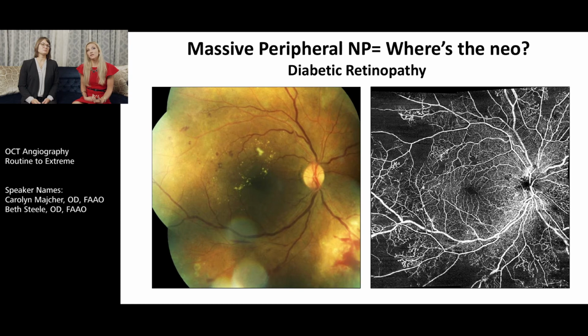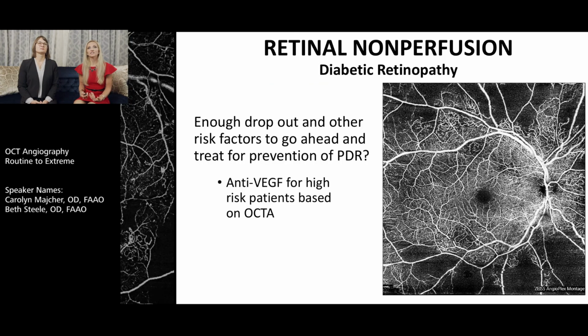And so this would have been data that we were missing if we didn't have OCT angiography. And I think this is probably fueling the growth of neovascular membranes which were located on the disc and elsewhere in this particular patient. So there's a trend in practice today towards treating patients with anti-VEGF agents or even PRP or laser earlier on in the course of the disease.